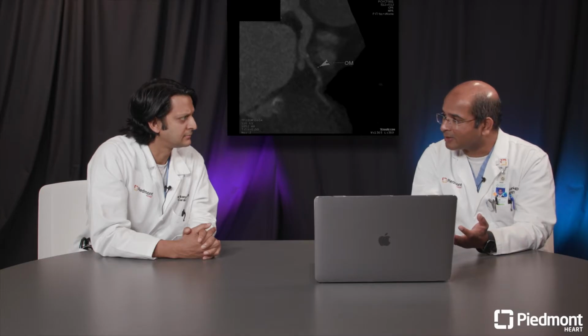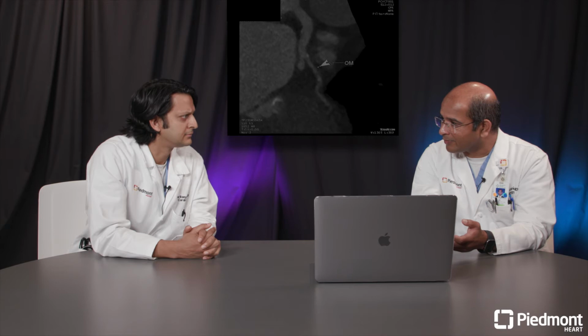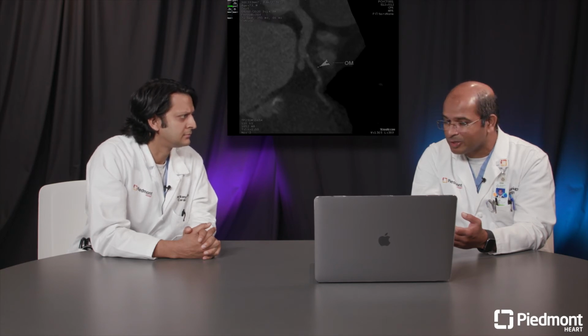You avoided a transesophageal echo and a cath in this patient, and you planned everything based on the CT going into the surgery. Yeah. And I think the patient tested COVID negative, but he came in with fevers, in the situation we are in with COVID. I think this is a unique way of using CT, CCTA, for imaging these patients.